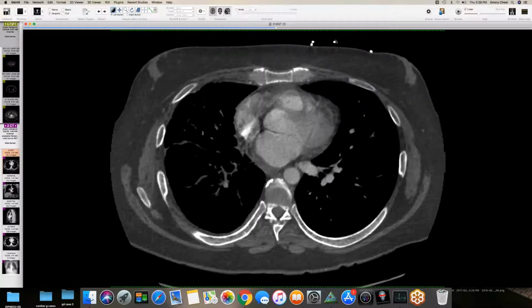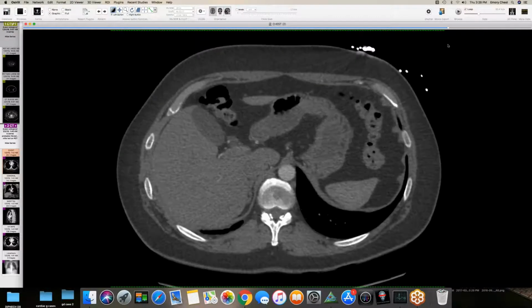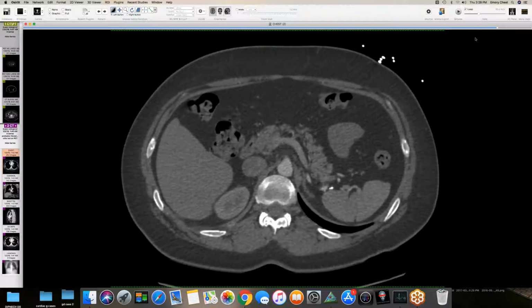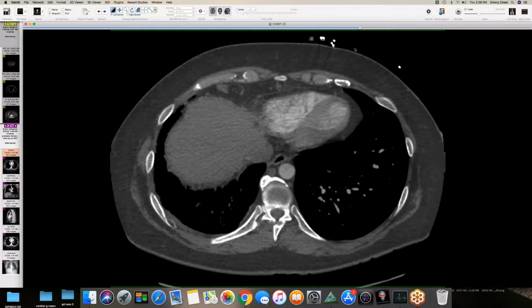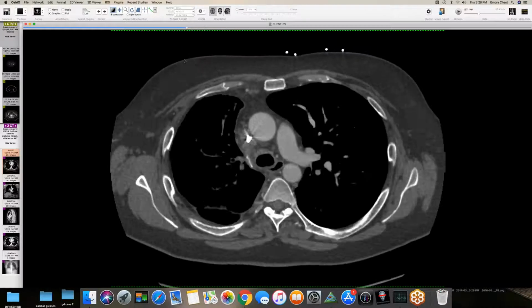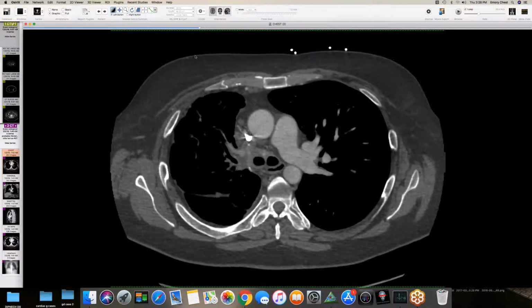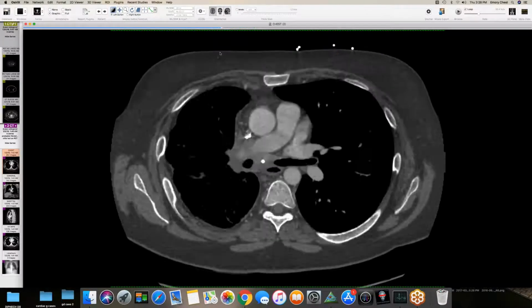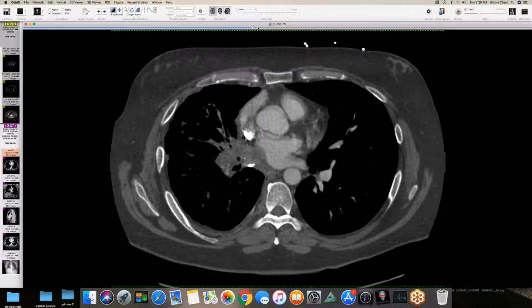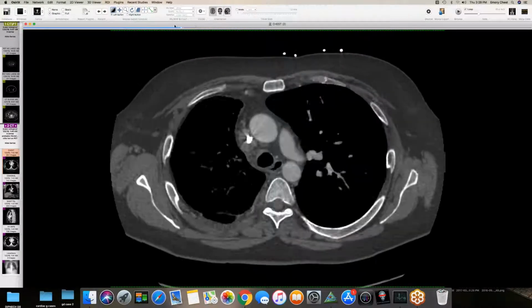How about the spleen, Brent? Are there any calcifications in the spleen to go with histo? Yes, there are multiple calcifications in the spleen to go along with histo. So presumably this is a fibrosing hilitis, fibrosing mediastinitis appearance that happened quite some time ago, with the extrapleural fat hypertrophy and all the secondary signs here as well.